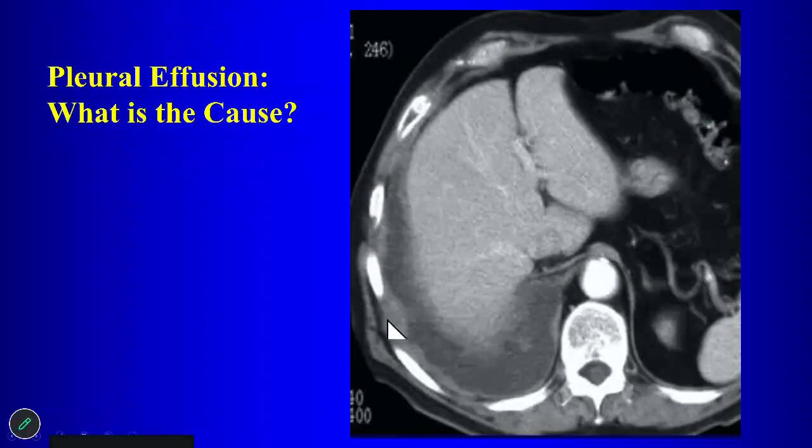Okay, so when you have nodularity along the pleural surface and pleural thickening, you have to consider neoplasm, so malignant pleural effusion, right? So your differential for what could give you a malignant pleural effusion or pleural thickening, you mentioned metastatic disease from any tumor, right? Lung cancer or any tumor, breast cancer, etc., can metastasize to the pleura. Is there anything else that you might consider in your differential for this particular patient, if this is all you have, besides metastatic disease?